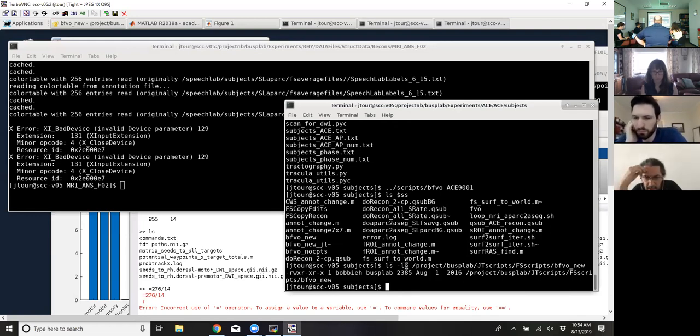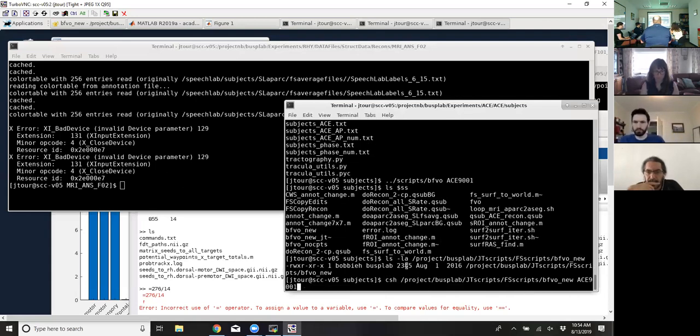This is the one that you cannot run directly, the BF. What I found, it seems to be something about addressing it through the environment variable. So if I did this, if I did, oh, I see what you mean. It's using the environment variable as part of the command line itself, right? That's what you mean.